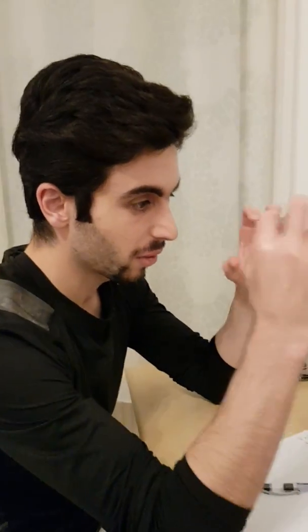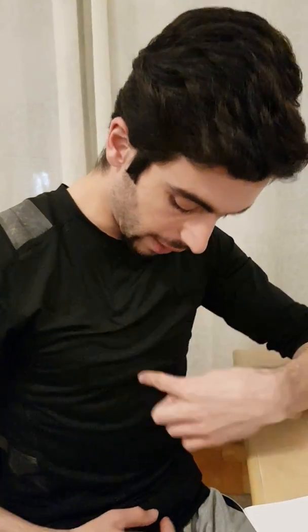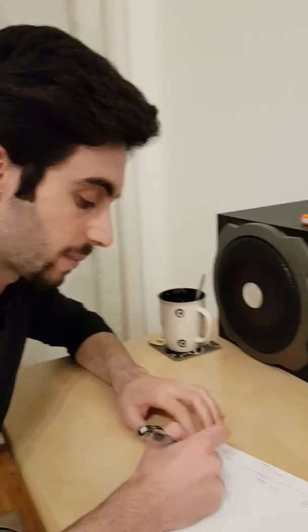But if you have another focus, let's say this is the atria, giving to the ventricles. If there's another point other than the SA node firing from here, then you will see another P wave that gives another QRS. And the thing about this P wave is that it would look different than the P wave from the SA node that we're used to, which should have normal morphology. We'll talk about these another time, or maybe I have talked about these earlier. So let's start with these.